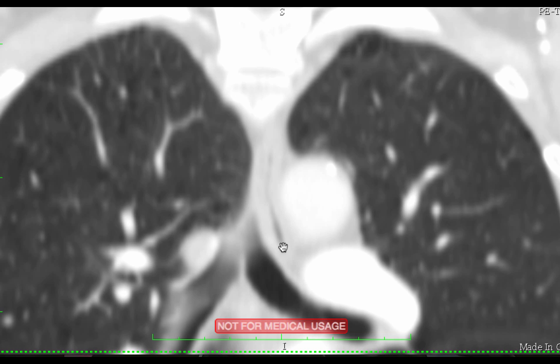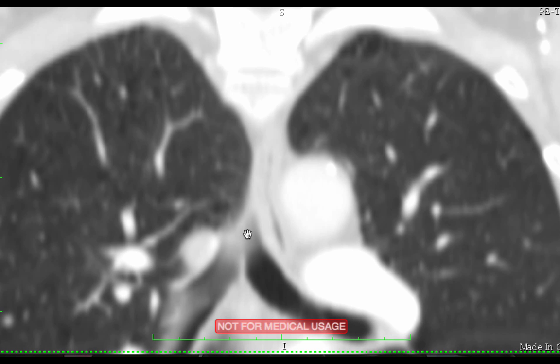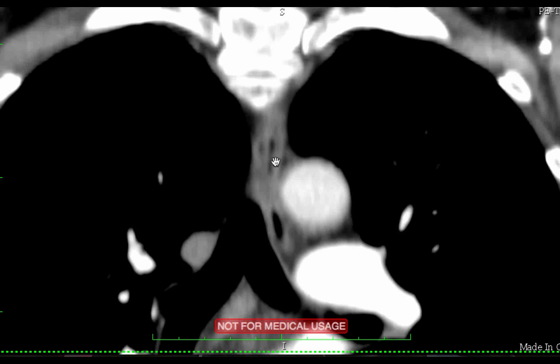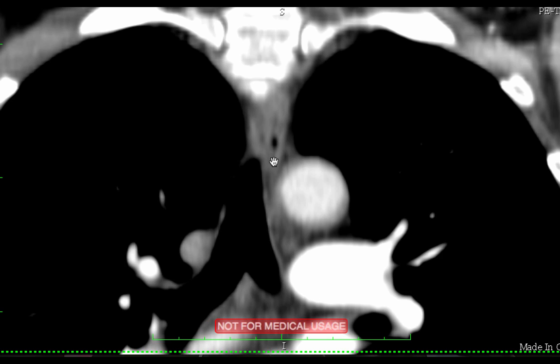Let me ask you this. Here is a lucent line that looks like it's a gas-filled structure, and it's outside the airway. What would that be? This would be the esophagus. Okay, it often has a little bit of air in it, and sometimes you can see a lot of air in it, especially if there's a big hiatal hernia.